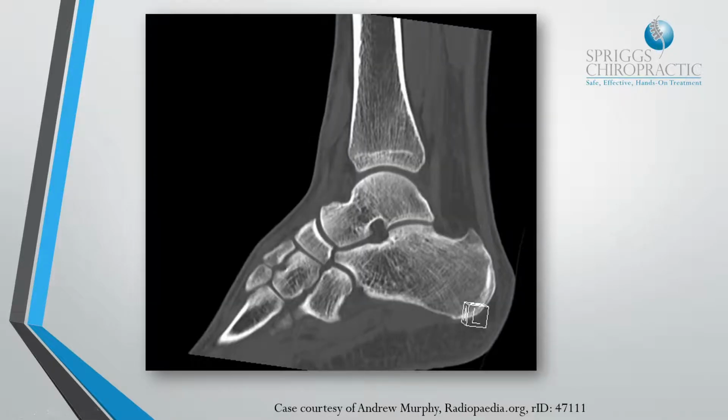And here it is on a CT scan as well. So again, the great thing about CT scan is the trabecular evaluation is absolutely fantastic to see the trabecular pattern within these structures. And of course, anyone who's got more advanced training and has gone through trauma series and pathology will understand the importance of being able to see the trabecular pattern.